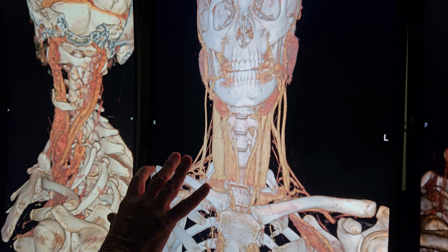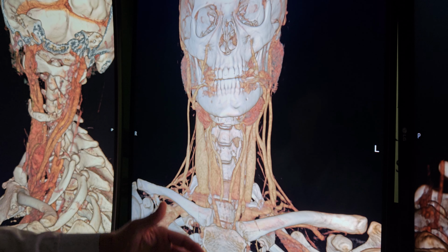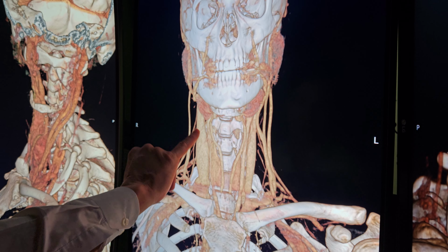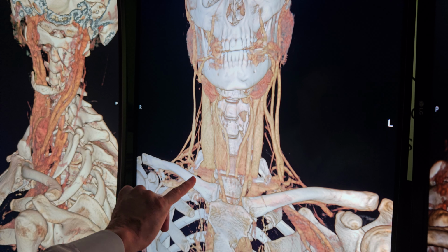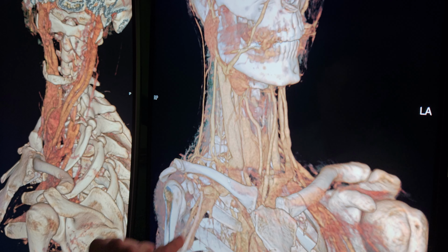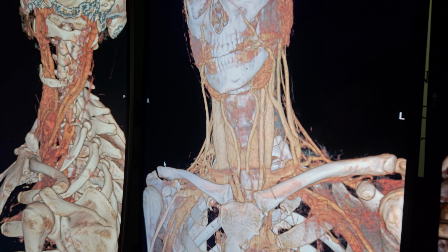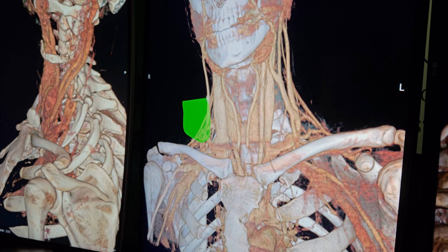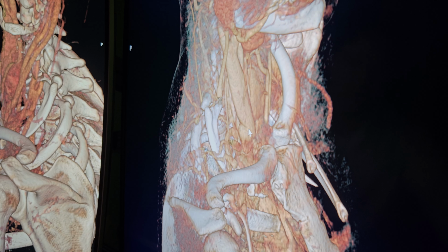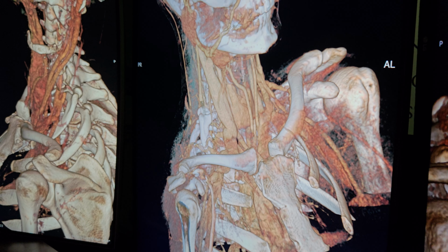Okay, so venous meaning that the contrast is now going through primarily the venous system and not the arteries. So here we can see that the jugular vein on the right seems to be dilated. Here you can see, actually we also got, hopefully I can dissect this quickly on the fly. There's a seatbelt injury on the right. You can see clearly where the seatbelt is, or some sort of adhesion or something, scar tissue. Adhesion is the word we've decided on.